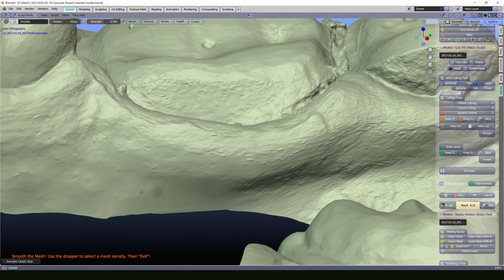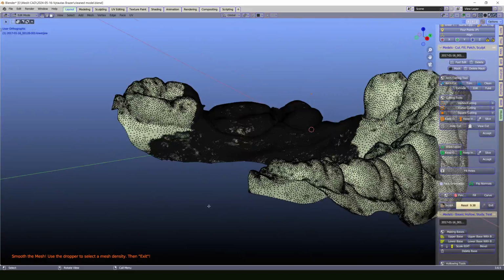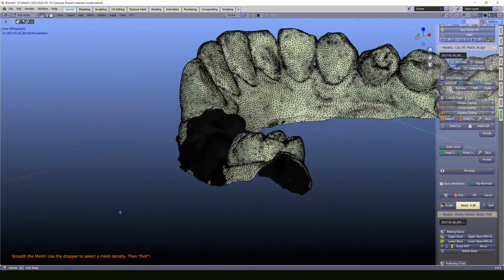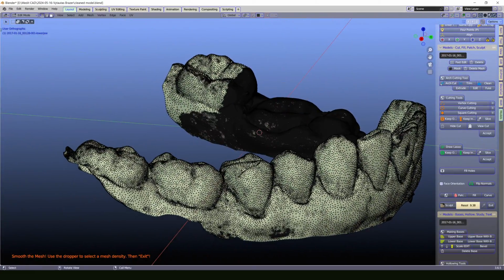And let's try it. Try again. And let's go to the edit mode to check it out, how it went. Really, it's not bad. We can do the same thing to other areas, which we have been fixing. If it's needed, of course.